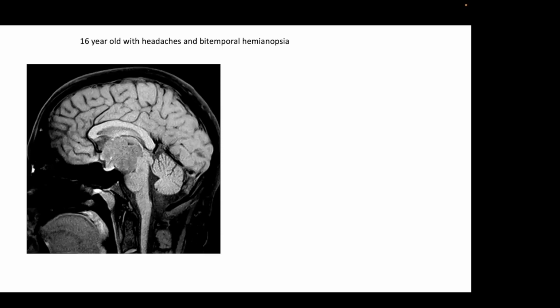Now, you mentioned craniopharyngioma, which I think is an excellent starting place for a patient of this age. Is there anything else we should consider in this location? Meningioma in this location. Okay, always a thought. They can arise from the tuberculum sella, they can arise from the diaphragma sella and the dorsum sella. Excellent. Okay, what else?